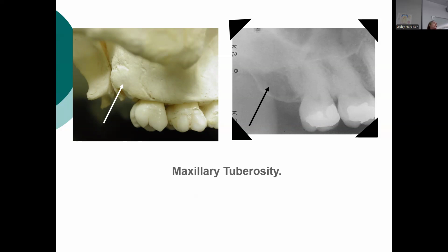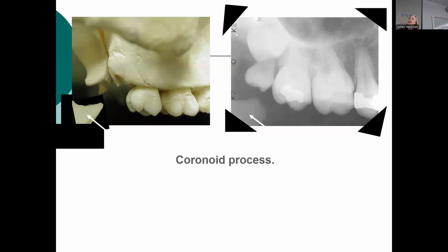That's definitely getting a little bit above my pay grade, but I know sometimes it really is the way the x-ray was exposed. That can add to the weird look, because that whole picture looks kind of light. So I think it can be kind of funny like that.